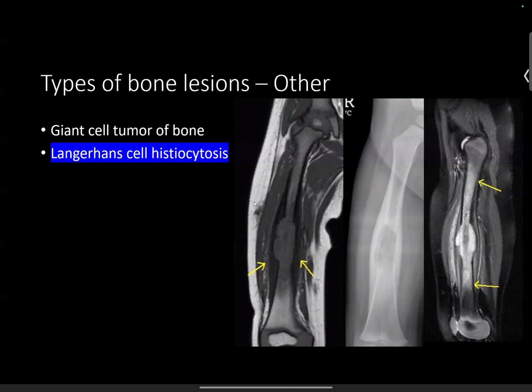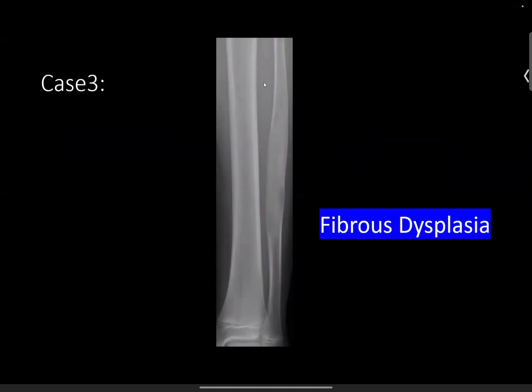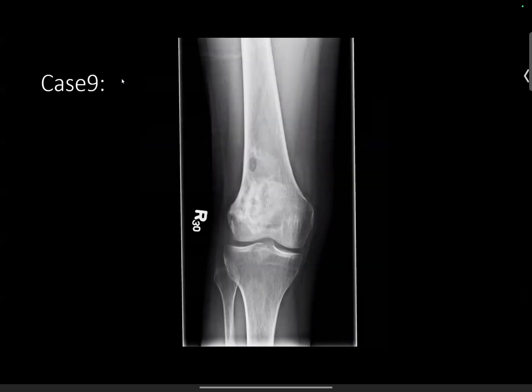Okay. Can you show us case 9 again? Can it be an NOF or a CMF? I don't remember this case. Okay, so is this the case? I may be on the wrong case, but this patient, I think, just coincidentally had a small little NOF here.